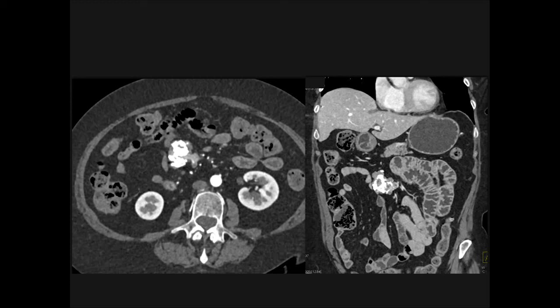It could be a mesenteric mass like a carcinoid tumor, but then you see desmoplastic reaction. Maybe you see a mass in the small bowel, but you always see desmoplastic reaction, and you're not seeing it here. I have heard of cases of TB with calcification, but that's like peritoneal seeding, and the patient's usually from Africa. I was once quizzed on a case of a patient from Ethiopia.